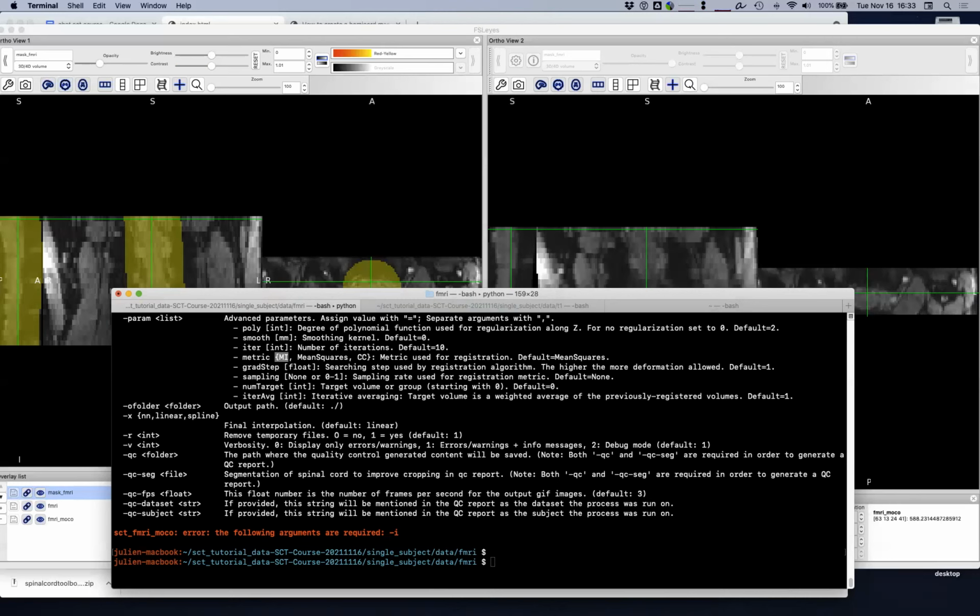Yeah. And then I made it a little bit bigger still. And then you get into the contrast between the bones and the other muscle and fats around. And that actually provides actual information to guide the registration algorithm.